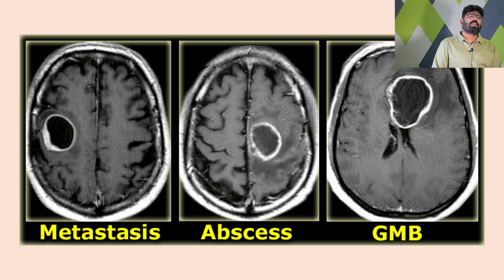And coming to this, this is the important slide. Most of the time you are able to see a large abscess, and the abscess will be very irregular, or it's a GBM. You don't know the lesion; it looks like an abscess, and it also looks like a GBM. Then how do you differentiate?